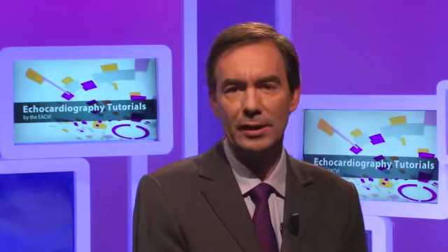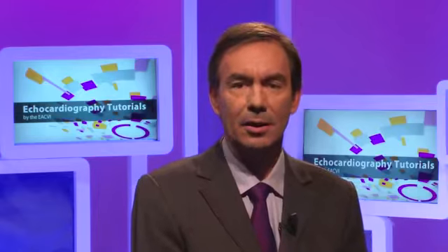Philippe Inger will explain how to assess patients with multivalvular disease. He will illustrate in two cases the interaction between two valve lesions. He will also elude the importance of using the methods less dependent on the loading conditions in this particular setting.